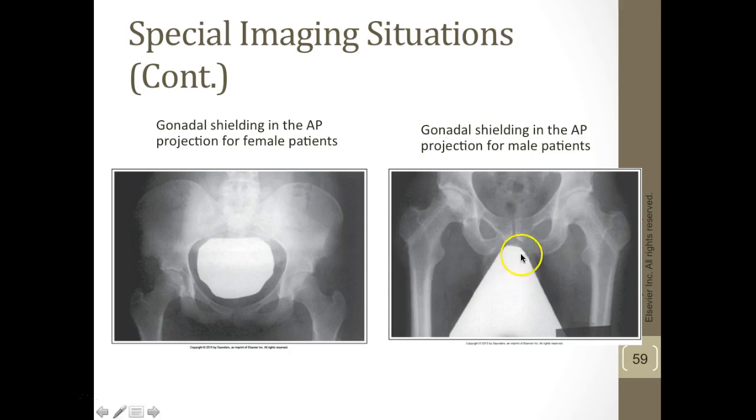For male patients, I do expect to see some kind of shielding. So this is a great one for the pelvis. You can see it slides up right over the gonads there on the patient.